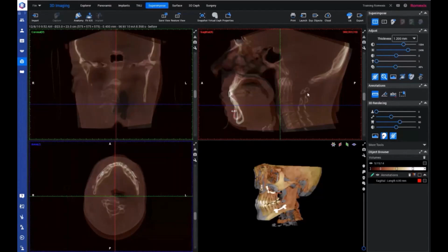You can work with those two different sized volumes and two different resolutions. The only thing that you need to remember is, of course, that you need to have some places in the image that you can match reliably. So that is the only thing that you need to take into account there.